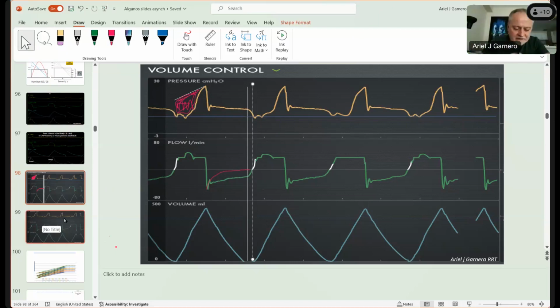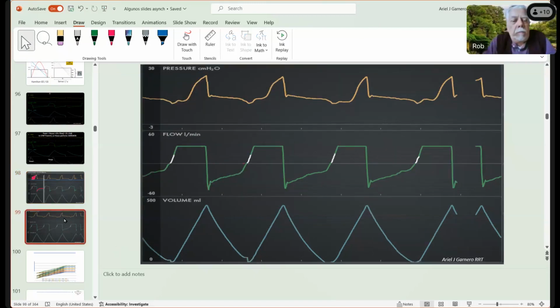Okay, we have about 5 minutes to go. I can provide a following sequence, which is the same mode, same patient. In this case, the extra flow is not activated. Is this the same patient? Same patient.